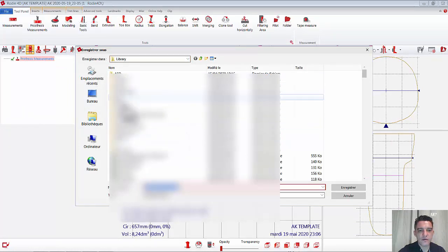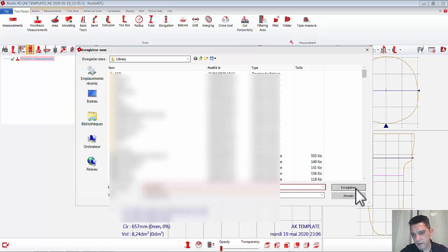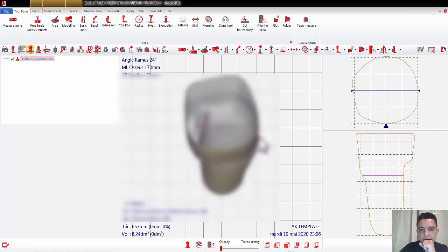And after this, in your library, you rename it like template AK webinar. And that's all.